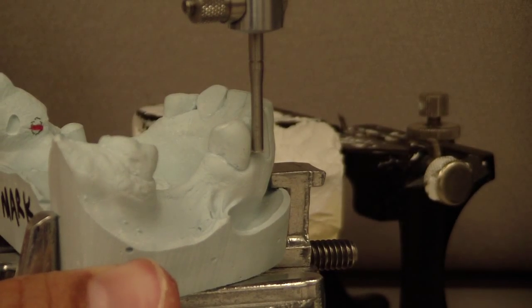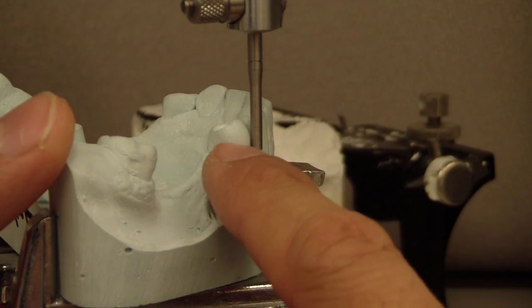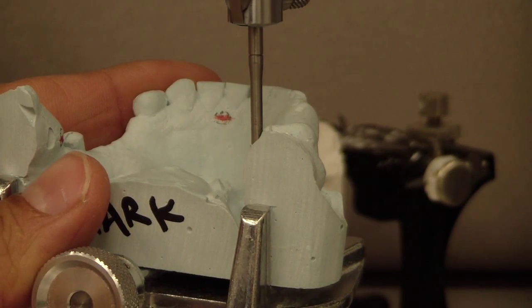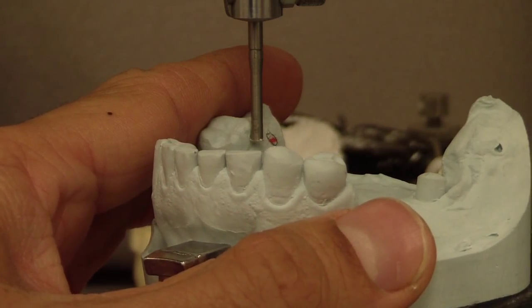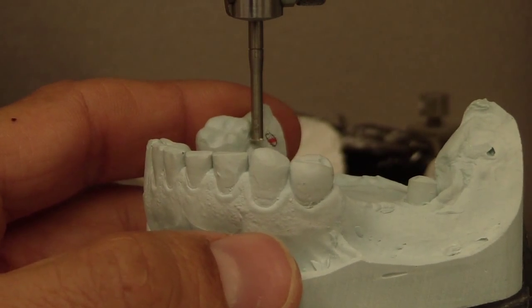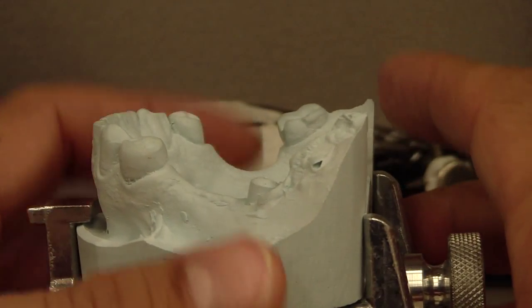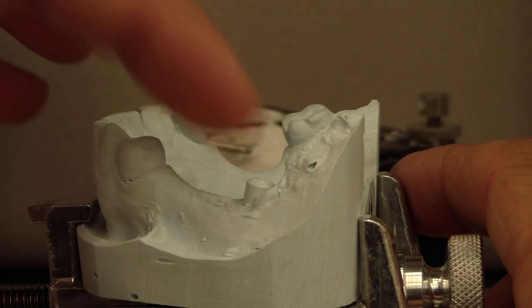And here I'm just showing you engaging that mesiobuccal undercut, the 100th of an inch, .010 on the mesiobuccal of this premolar. Additionally, you can see we're going to be engaging just right there on the lingual portion of where I placed that composite on that molar. So we've talked about it: we have a mesial rest seat, we have a distal rest seat, and a positive vertical stop.